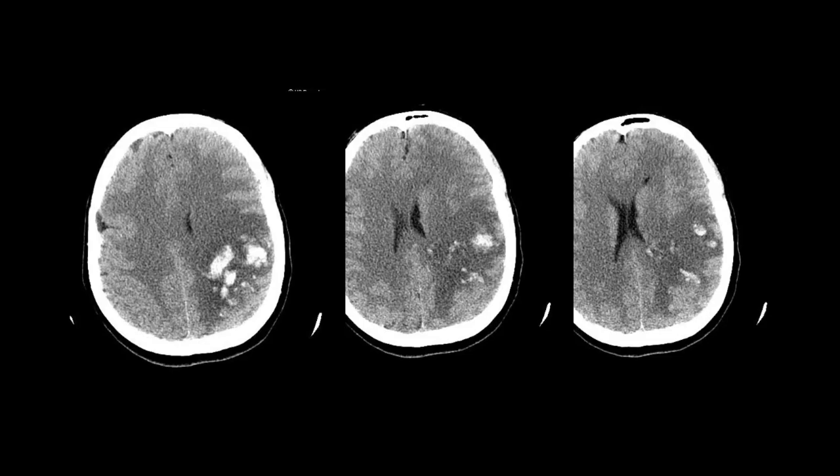The other thing here that is quite striking is that there is some interspersed edema in between those patchy foci of intracranial hemorrhages. So one thing that you might think of would be the hemorrhagic transformation of an ischemic stroke, but what doesn't work that well here is the distribution. It doesn't really conform to a vascular territory, or at least I should say an arterial territory. And so here, the entity that you should think of is a venous infarct. That's the typical appearance of a venous infarct.